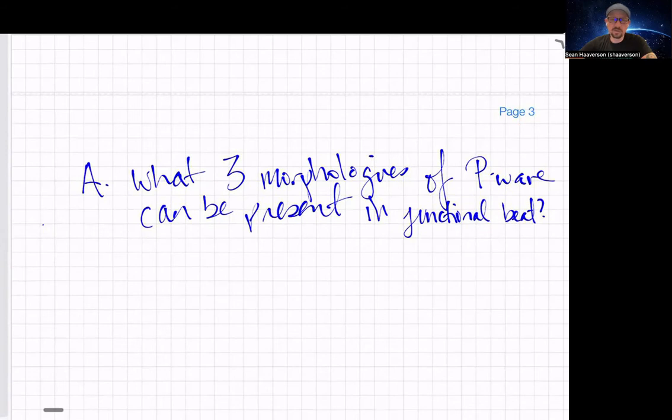Okay, so welcome back. So if we're answering this question, we'll want to just first preface this by saying, if we're looking at lead 2, we would expect that a normal sinus rhythm would have a P wave that's originating upright before our QRS. So there's a few variations of that that would present in a junctional beat. Now the junctional beat should have still a pretty narrow QRS because this is originating above the ventricles. So the speed it takes to go through and originating at our pacemaker is still going to be pretty quick. So the first presentation might be that there's an absent P wave. The P wave's not present.